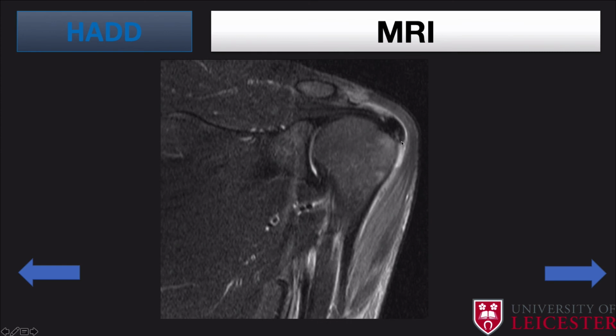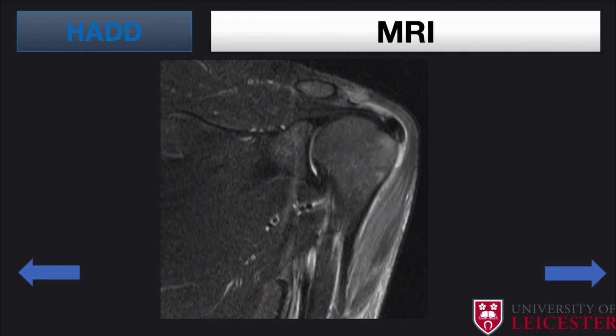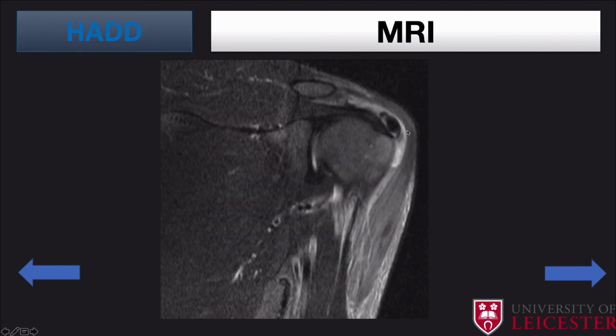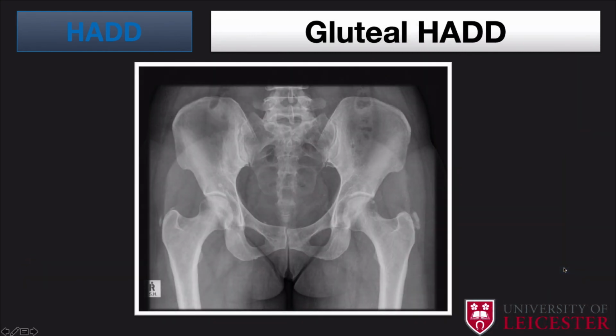And classically, it's calcific foci in the superficial fibers of the supraspinatus tendon insertion, suggesting inflammation. And this bursa is what we call the subacromial subdeltoid bursa. So just think, young patient, very, very painful, really sudden inflammation. That's when you've got to think of hydroxyapatite deposition disease.